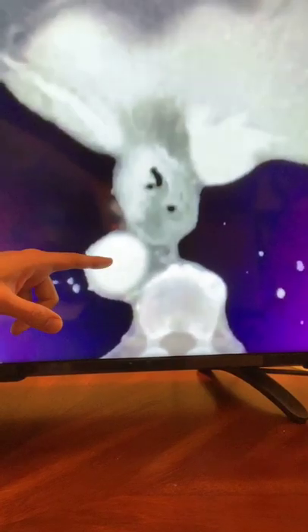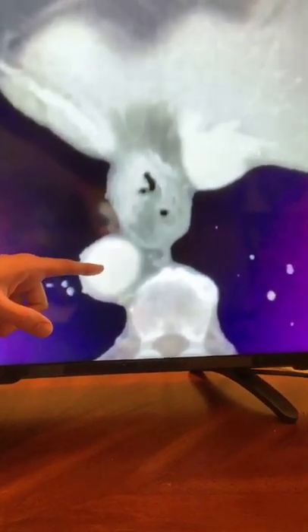I showed you guys this image and I said, what's going on here? Just for anatomy. So if you look, this is the vertebral body. Remember my general rule of thumb, if the bones are super bright white, you're looking at a CT. If they're dark, you're looking at an MRI. So we're looking at a CT because I'm looking at that, right? What's the bright structure right here? That's the aorta. That's how we know it's a contrast-enhanced examination.